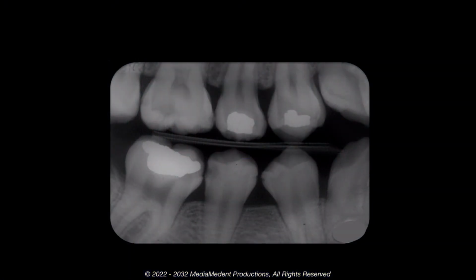Early proximal caries is observed as a small radiolucent notch in enamel just apical to the contact area. The arrows are pointing to beginning proximal lesions on the distal of the mandibular right first premolar and the mesial of the mandibular right second premolar.